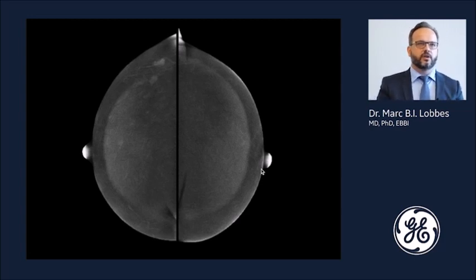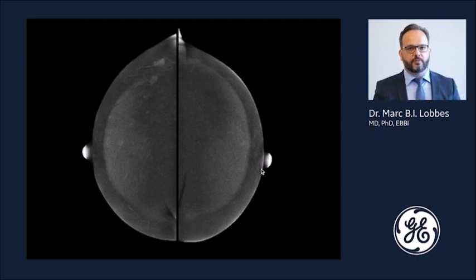Sometimes you can have some background parenchymal enhancement like you have in breast MRI, but then usually you see this patchy enhancement on both breasts in a similar fashion. But if you have a very apparent asymmetry, you should be careful and at least look at it more carefully on the low energy images to detect whether you have any calcifications over there, or perhaps do a targeted ultrasound of that area. And for the future, we also will have the ability to do contrast-enhanced guided biopsy.